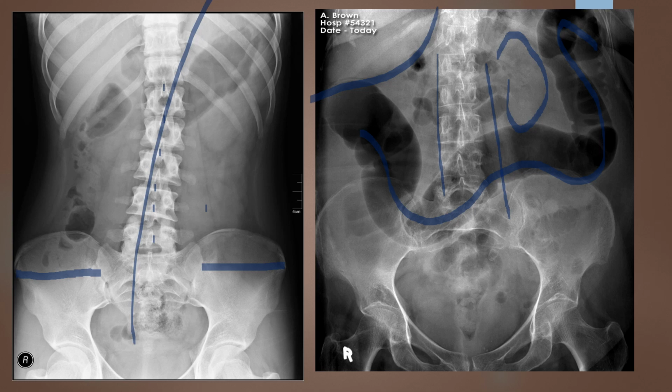So you can see, unfortunately, somebody did not anonymize this image. I think it's fake information, but it's not anonymized, so patient information is there. They do have a letter marker on. Finally, we have a letter marker, a real one. So legality-wise, this looks pretty good. Anatomy-wise, it looks good. Technique-wise, it looks pretty good.